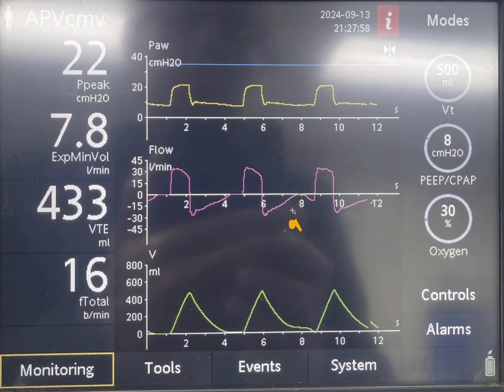So we're assuming that this is an inspiratory effort by the patient. The patient ceased exhalation and tried to initiate inhalation. You don't see any negative deflection here to confirm this, but it is certainly that the patient stopped exhalation here, most likely because he wanted to initiate inhalation, but he could not trigger the ventilator.